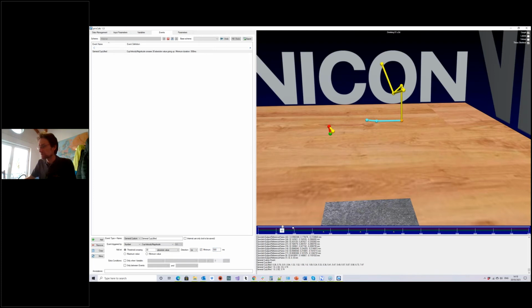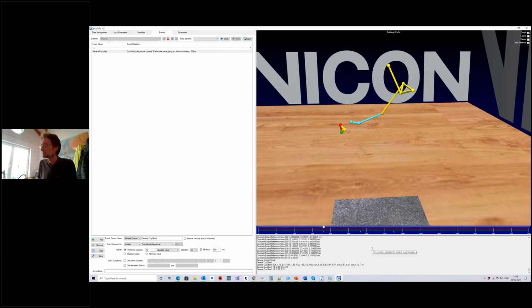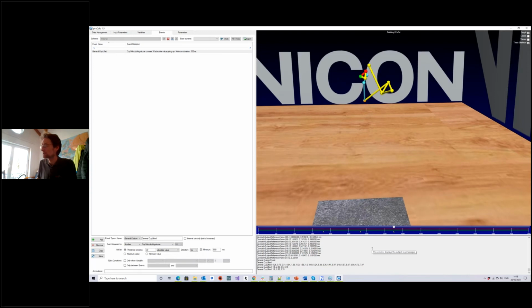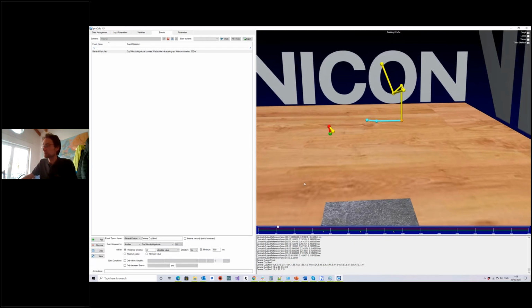Now, what you can also see here is that ProCalc immediately then calculates these events. One here, and one here. So these two events are the velocity crossing the same threshold due to the subject accelerating or decelerating the cup as he or she is drinking.